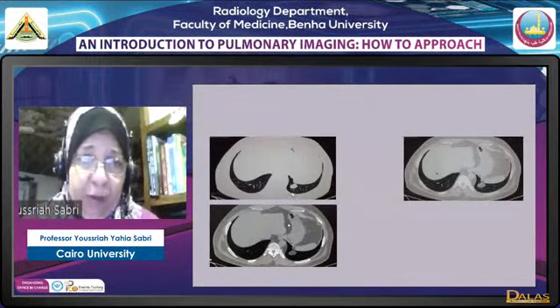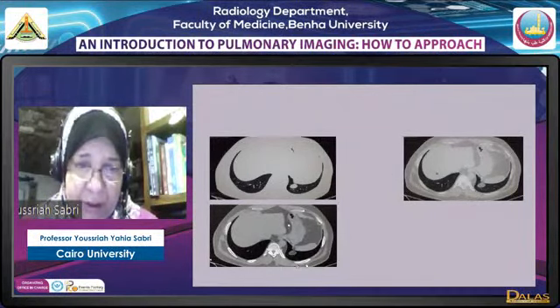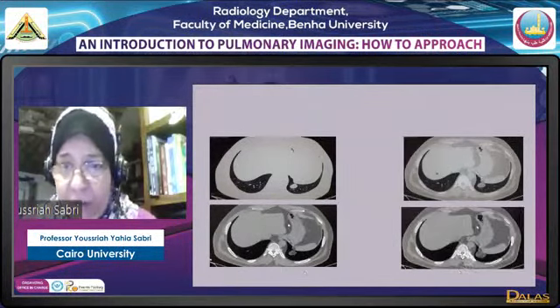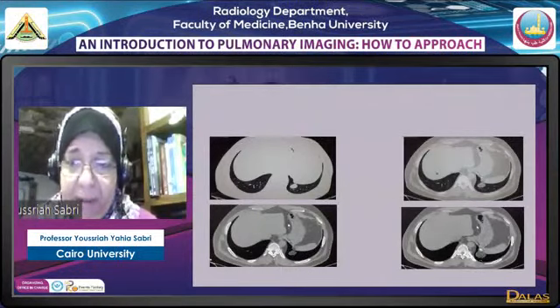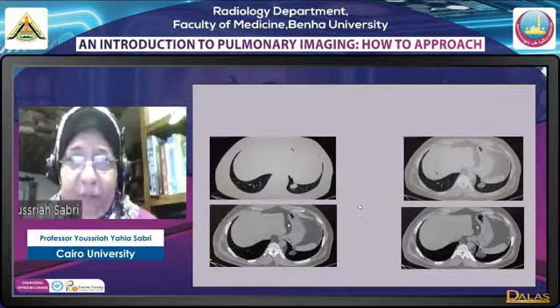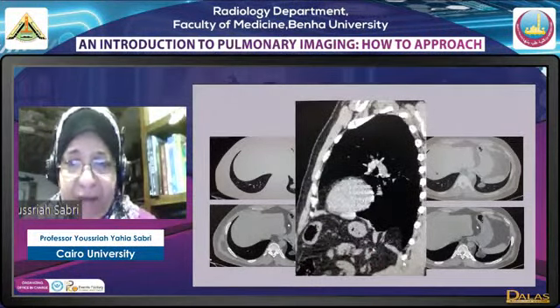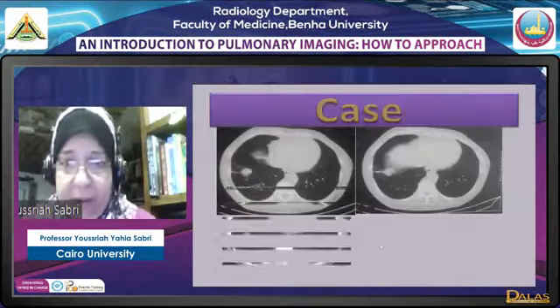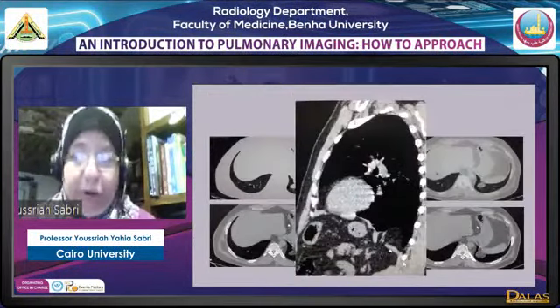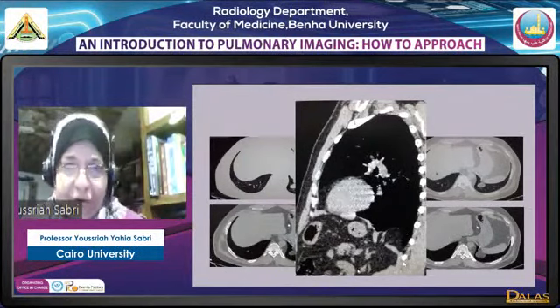So here we have a very suspicious lesion of single pulmonary nodule. Shifting to the lung window and the mediastinal window, what we had is appearance suggestive of fat. Going through the mediastinal window, there was suggestion that there is a perforation or an opening in the diaphragm, a defect. So reconstruction images showed that we actually have a defect in the diaphragm, and this was nothing but a small diaphragmatic hernia with fat, a hernia.